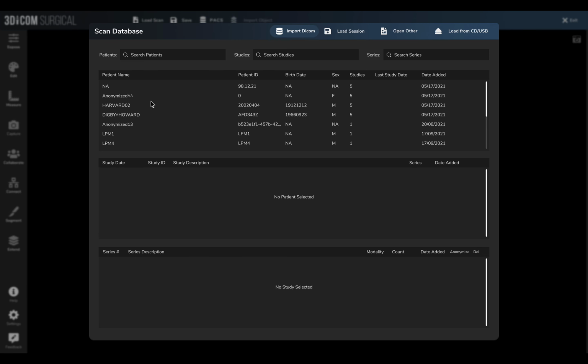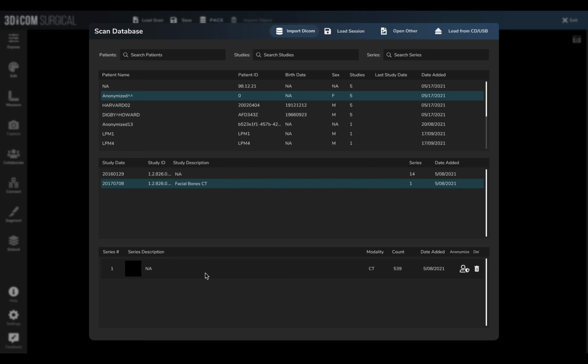Okay, so 2.7, just going to pull down the facial CT scans and it's preparing the file. So just giving my initial feedback, massive improvements made to this version, but still some small edits, which a lot of small edits I think will make a massive difference to how the software is interpreted.